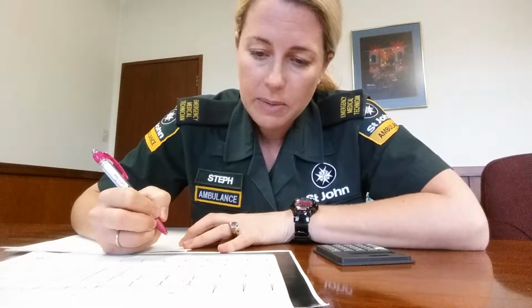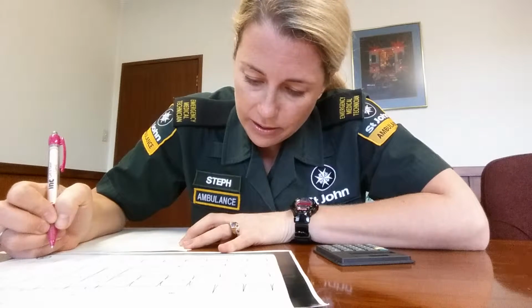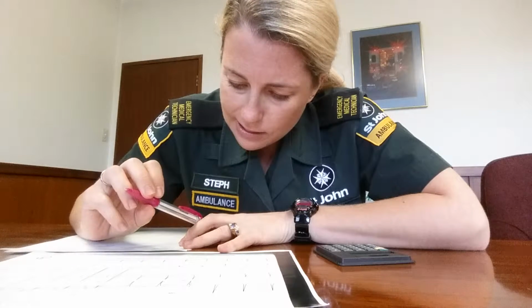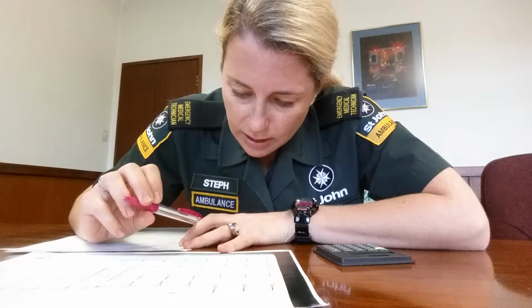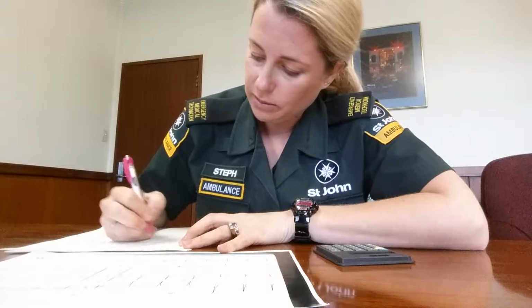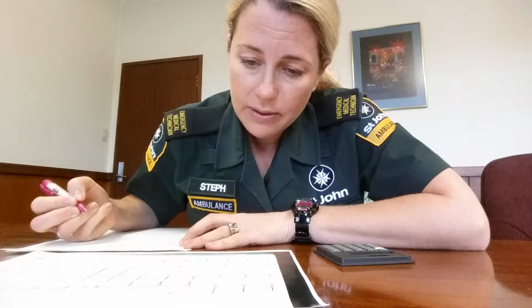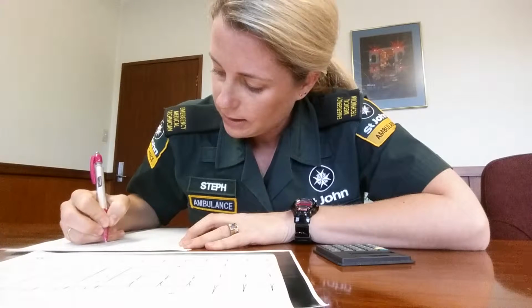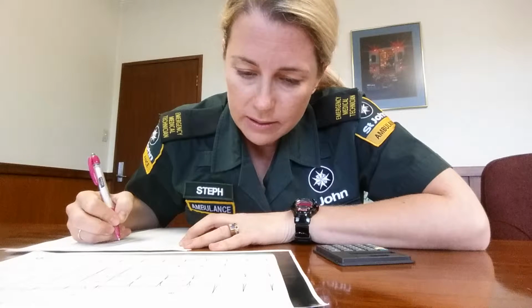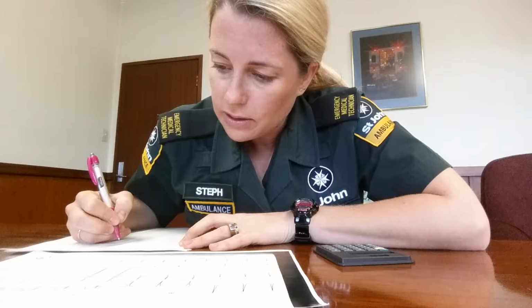The P waves should be upright and symmetrical, which they are across the leads, yes. And I've got a short PR interval, should be 0.12 to 0.20 seconds, and this looks like it's much less than that. I'd say 0.08 seconds. We have a short PR. And I've got a delta wave, which leads me to Wolff-Parkinson-White. So PQ, I'm looking for Q waves. Could be a Q wave in lead 3, but I'm going to go with that's usually Wolff-Parkinson-White.